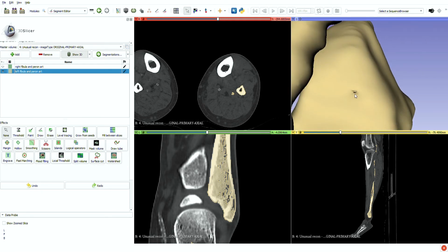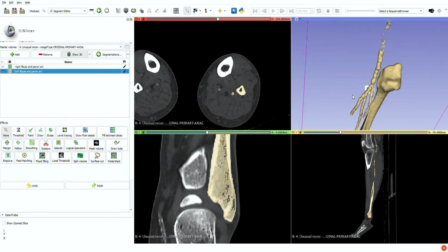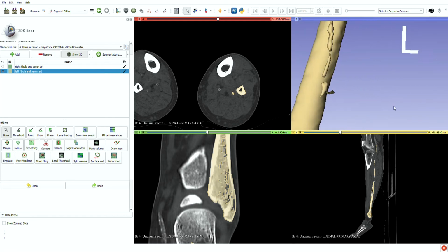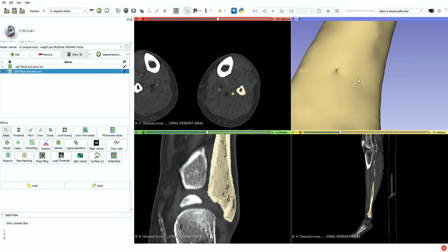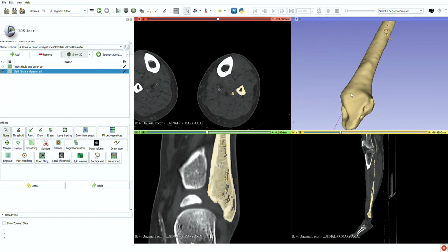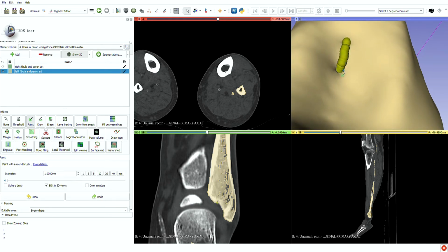I want to erase the inner vertices that will live inside of the cortex, and if these small holes are visible and present, that means that they're connected with inner parts, so I will not be able to erase those facets.